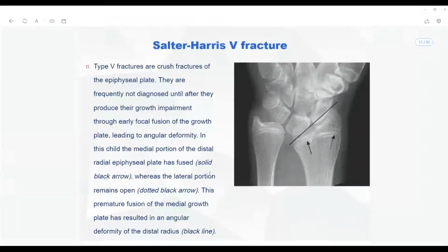So how can we see? Let's try to understand one thing here. What should be present? There will be impaction of the growth plates within each other, right? So this is the distal radius, okay? Then what we see here is that the fracture line is not particularly seen well. You can sometimes misunderstand this one as complete fusion, but when you look close enough you can see here that there is a hyperlucent line present. And how can I know that this person has not been fused yet when I compare to the other bones?